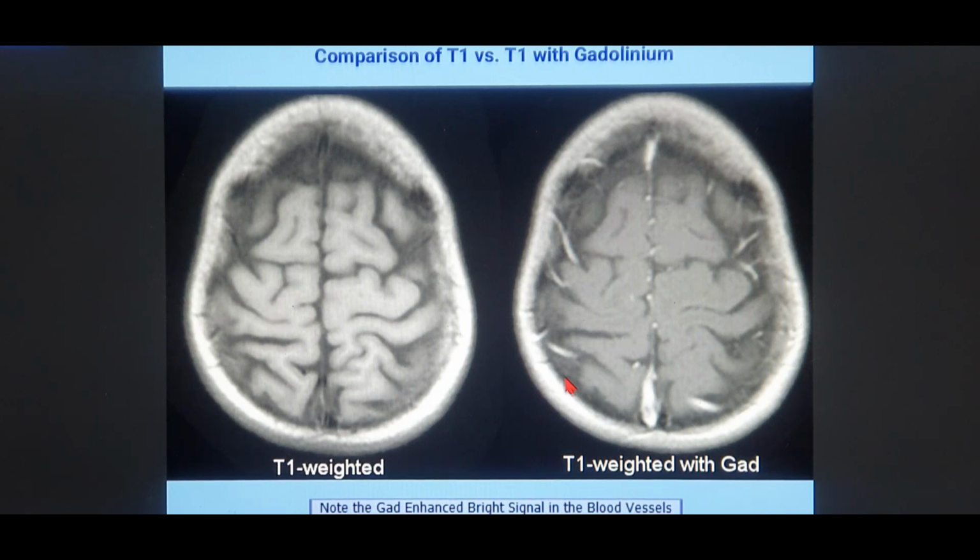So this is gadolinium, the contrast which enters the blood vasculature in the brain, and that appears as hyperintense slit-like blood vessels, which you can see over here.